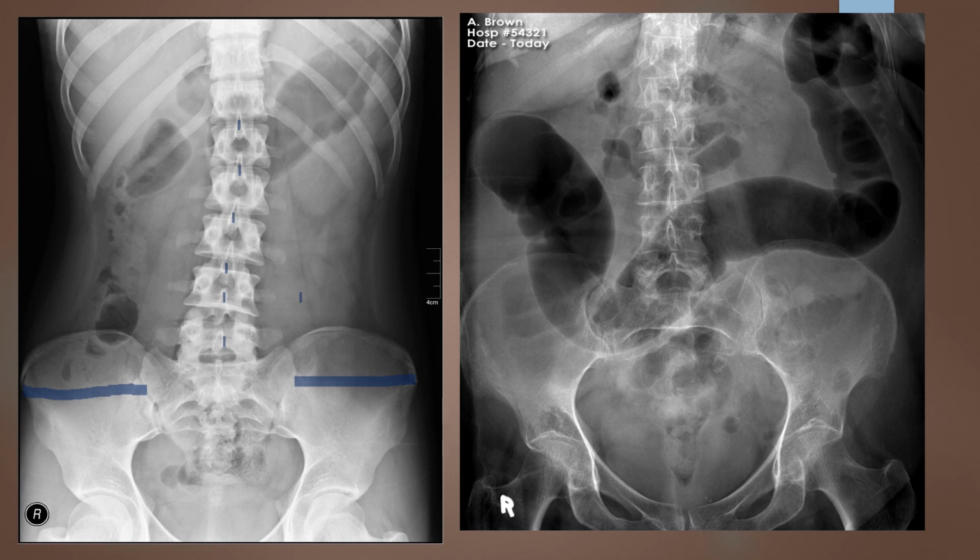If my patient was sitting up with their chest elevated, I would see those migrate upward. If their butt was elevated, I would see those move downward. So this looks like it has a pretty good mid-coronal, seems to be pretty parallel to the image receptor.